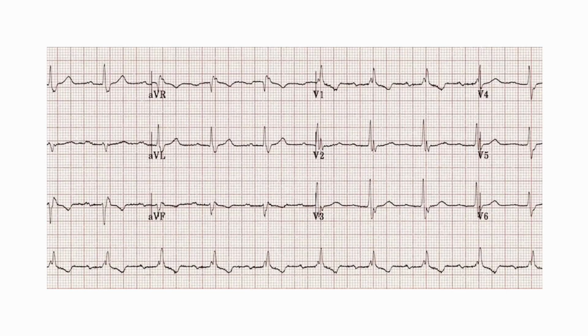Now this ECG is quite often tested in the exam. You will come across them while you are at work as well. If you closely look at this ECG, there is a left axis deviation and there is a right bundle branch block and there is prolonged PR. So this is a trifascicular block. If it's not recognized and treated quickly, this patient can go into complete heart block.